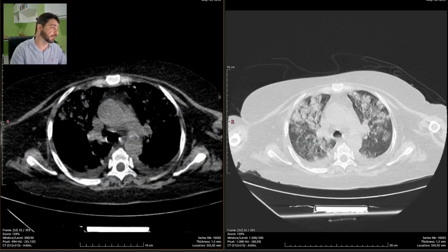So let's report this chest CT scan and get on to the abdominal CT scan, which is the last one, because this patient has split superior abdomen and pelvic exams. So there are another 2 exams of this patient right next to this one.